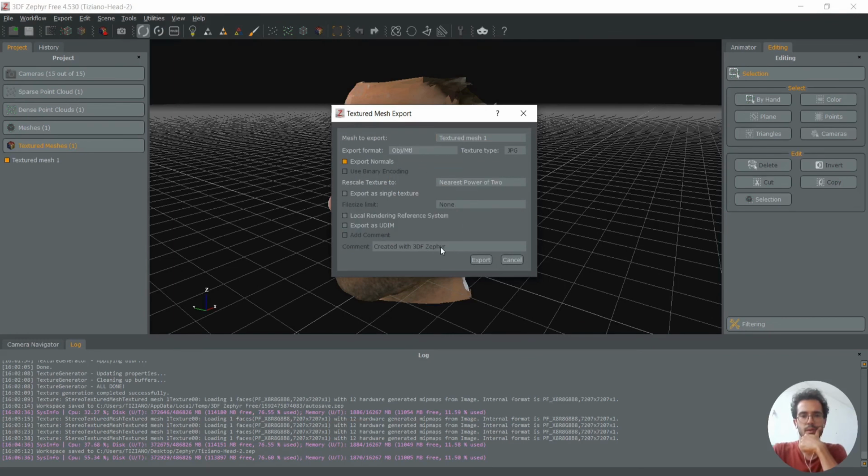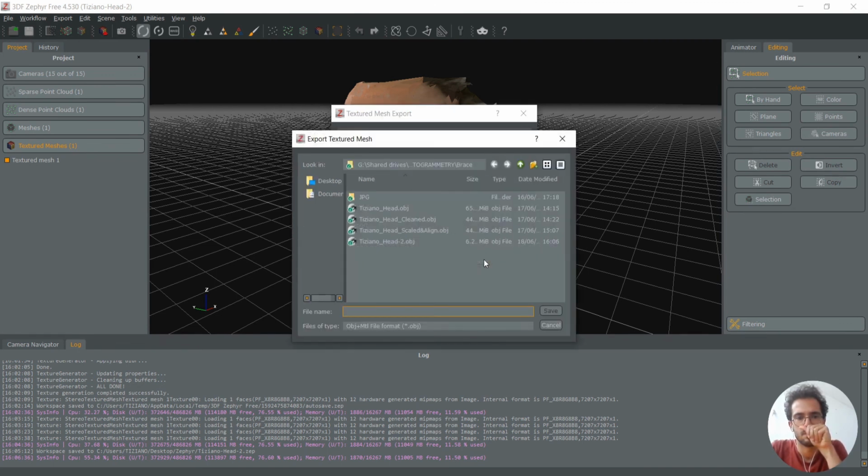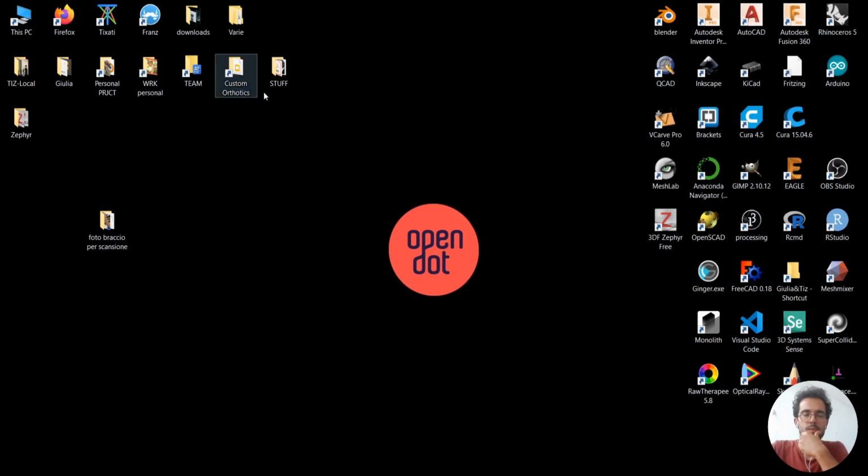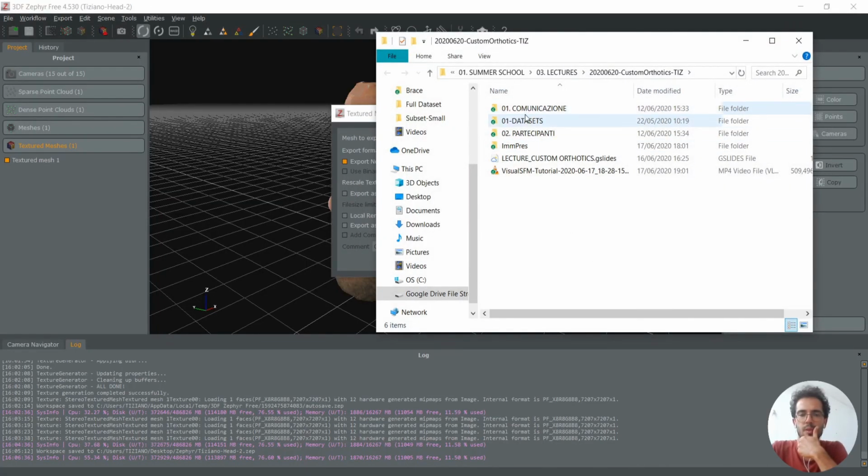I can go back here. So we just open this with some other software to see if the result is correct.